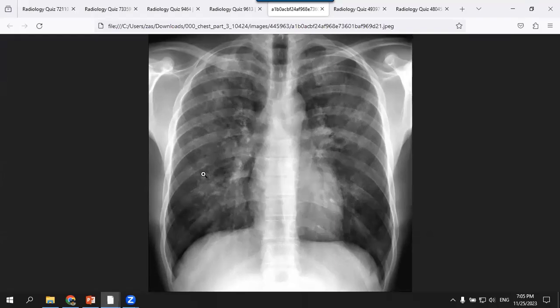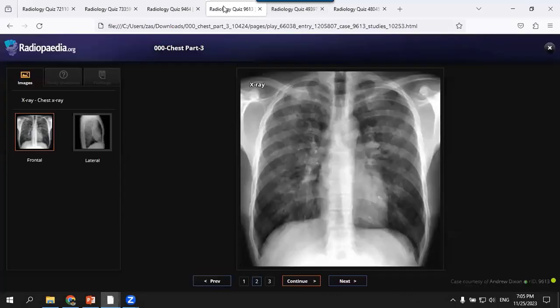I will correlate this finding with the clinical setting of this patient, and will compare it with any previous images of the patient. If this patient is coming with acute onset of fever and shortness of breath, and he is immunocompromised, I will think of infection at the top of my differential diagnosis, such as Pneumocystis jirovecii pneumonia.